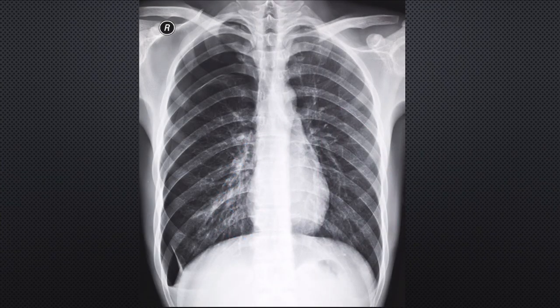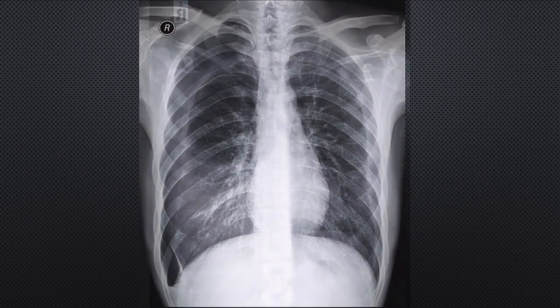This is a slightly more subtle example of a pneumothorax on the right. One of the hallmark findings of a pneumothorax is called a pleural line. In this case, a very thin white line is observed in the right upper lung zone, corresponding to the same position as the bottom edge of the right fifth rib. You also notice an absence of lung markings beyond that thin white line. Presence or absence of lung markings is not a definitive finding, however.